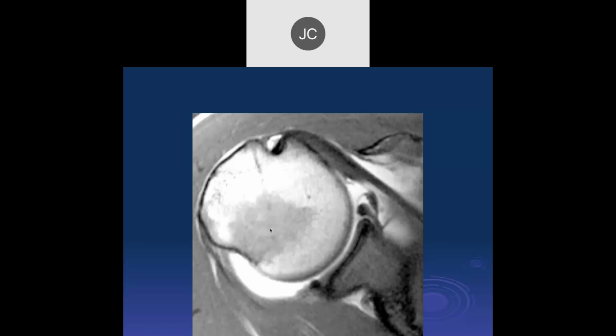So, Robert, what do you think of this case? All right, so we have an axial. Looking at the anterior labrum, it looks like there's a tear at the base of the labrum, right down here. So you're concerned about right there. Notice how smooth everything is here. It's the anterior superior part of the labrum. Be very careful about calling tears in this area. This happened to be a normal sublabral foramen.